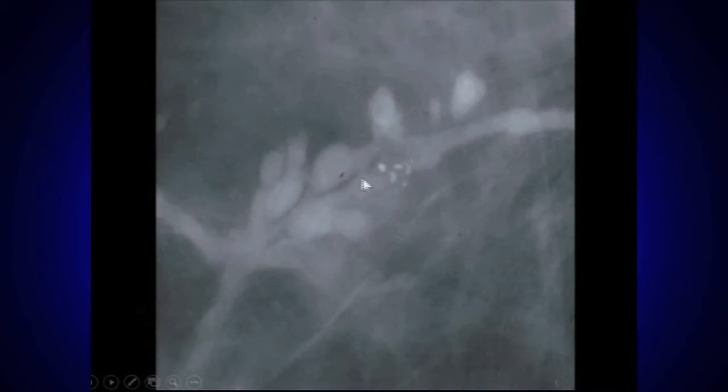Here we have basically some tiny clustered calcifications, or grouped, that are almost amorphous. They're so tiny. Here you have a group of about 6 calcifications within a 1 cm area. The patient had a bloody nipple discharge, was spontaneous. We did a ductogram, found a little mass in the duct, and that turned out to be a benign papilloma.